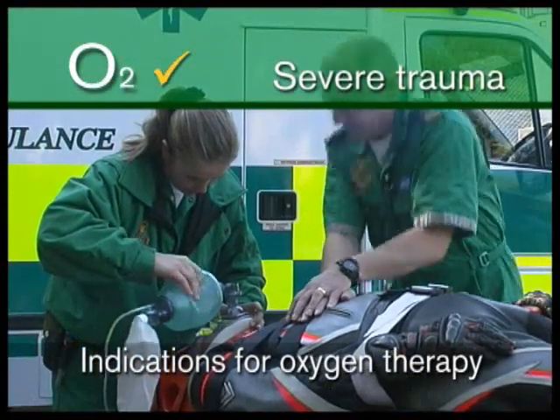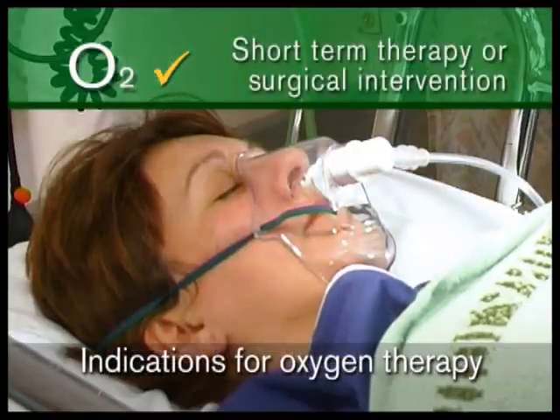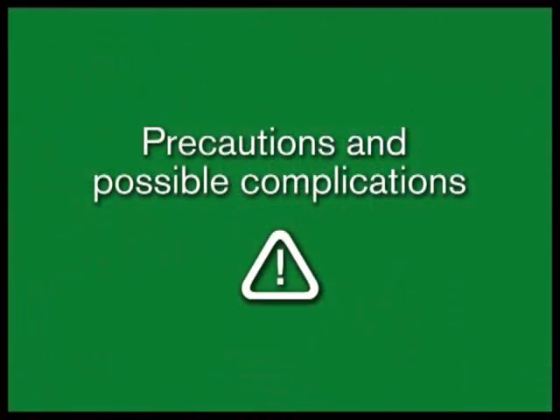Severe trauma, an acute myocardial infarction, short-term therapy or surgical intervention, for example, post-anesthesia recovery. Precautions and possible complications.